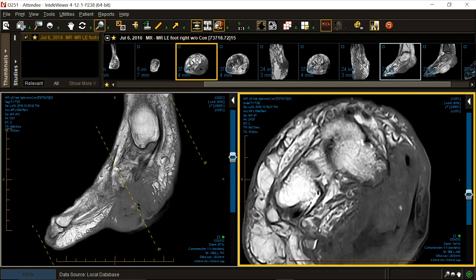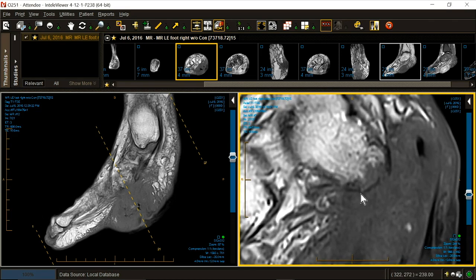How easy is that? Erased bone. That's osteomyelitis. That's cortical and subcortical osteomyelitis. Look how much money we are saving the Australian government. Let's keep going. For the gold. 253. For the gold. 253.